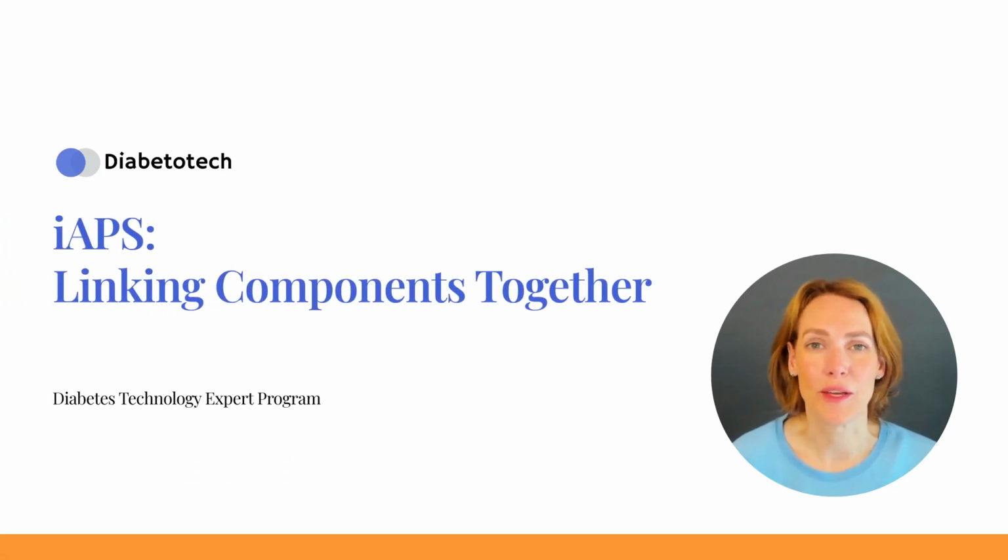In this video tutorial, we will guide you through the process of creating the necessary links within the iAPS automated insulin delivery system. These links establish connections between various components to ensure seamless communication and data exchange. iAPS operates in the following manner.